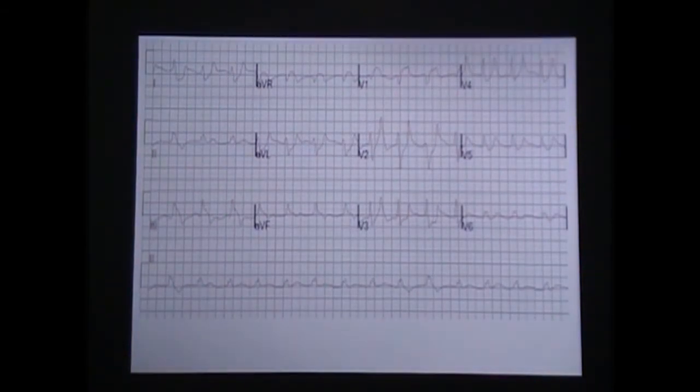If you look back on the notes, you're going to lose those P waves, get a widening of the QRSs, peaked pointed T waves. We hit all those boxes here, but it looks like a whole lot of stuff going on, so it can distract and overwhelm you. But if you take it systematically, you can start going, I think this is what it is.